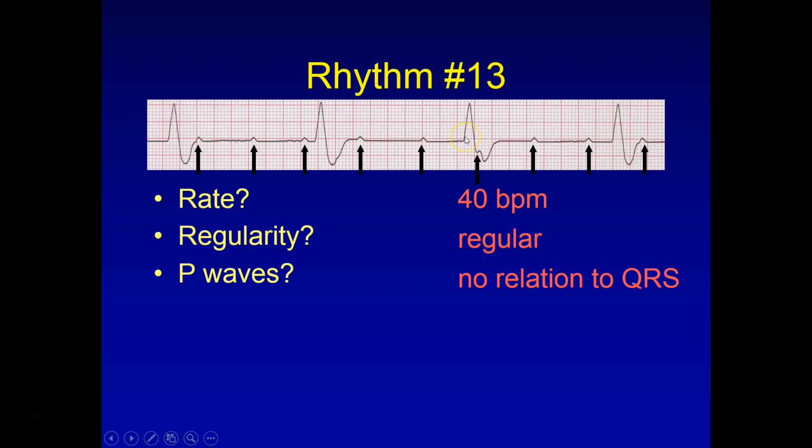Also notice that the ventricles are wide. What does that tell you? That tells you that the ventricle initiated its own inherent rate. In other words, when the SA node fails, you have the AV node as a backup, and if the AV node fails, then you have the ventricle as a backup as your pacemaker. So because the ventricles could not see any of the atrial activity, it's blind to it, it started acting as the heart's pacemaker, okay? Because it doesn't know that the atrium's doing anything, even though they look pretty.